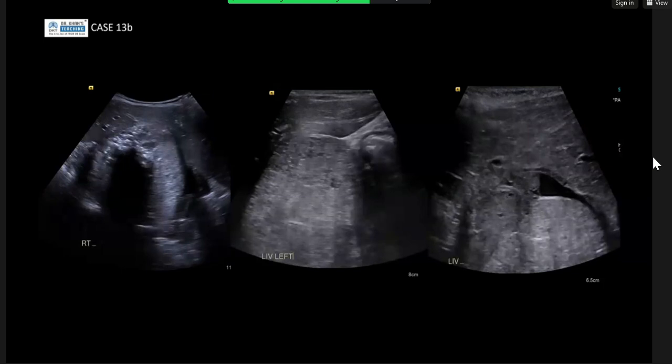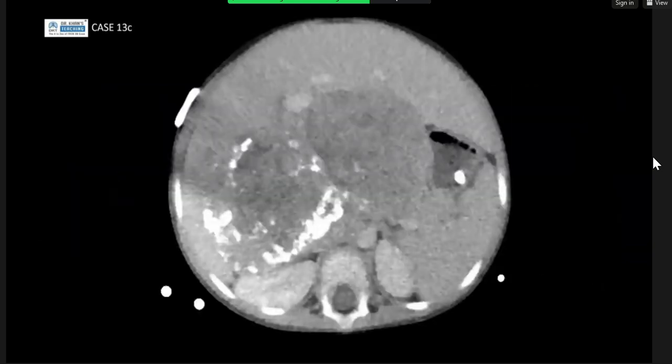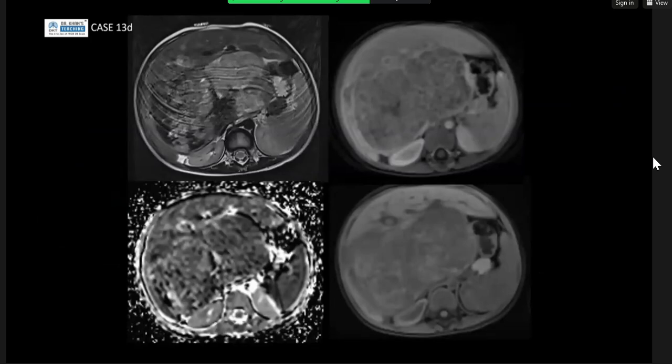So you can't just say it's thrombus because of compression or something by the mass. It's defined as tumor thrombus and invasion in hepatoblastomas. So it's really important that you assess the vessels if you are reviewing the case for an exam or even just clinically reporting one. Okay, thank you for that.